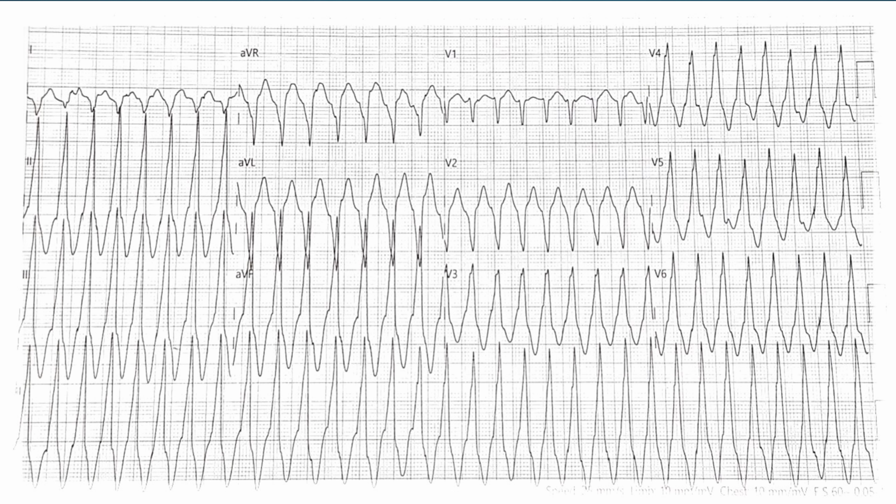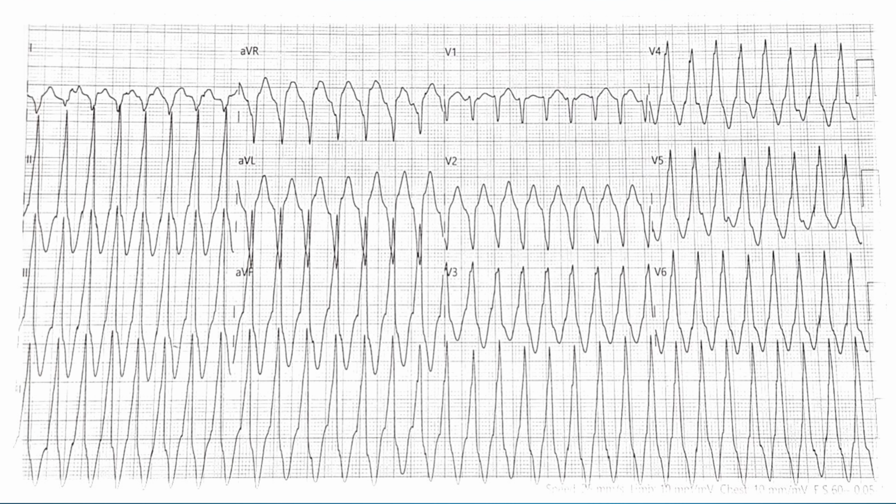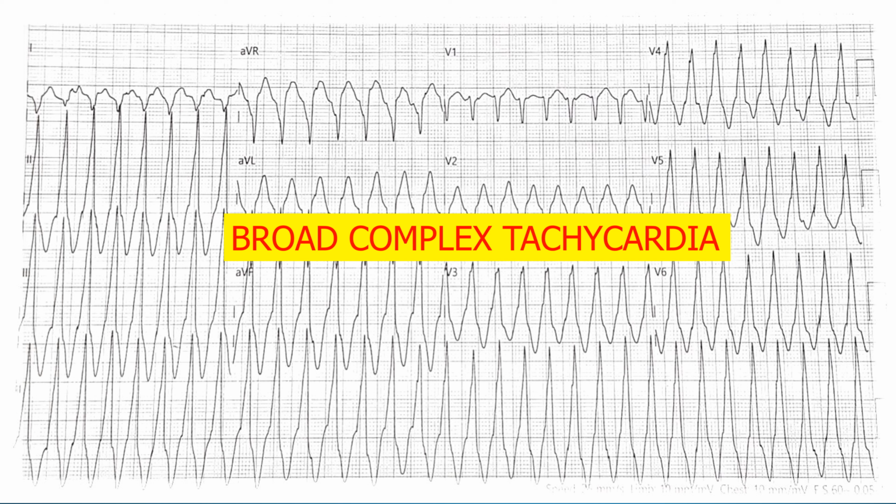Well, we can see that this is a broad complex tachycardia. Now we can obviously see that the QRS width is pretty broad.